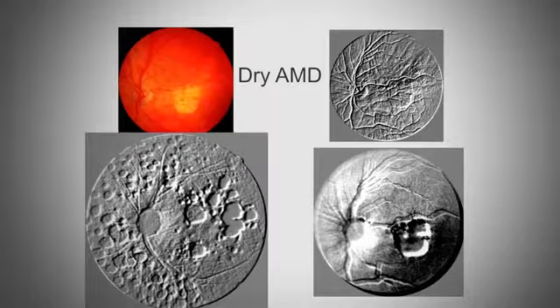But with this particular camera that I was using, the Canon CX1, I was able to pick it up because it's a single unprocessed image. And that's the key point here. It's unprocessed. Then I went one step further and I did the emboss on this particular image.